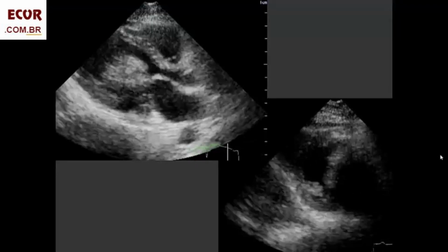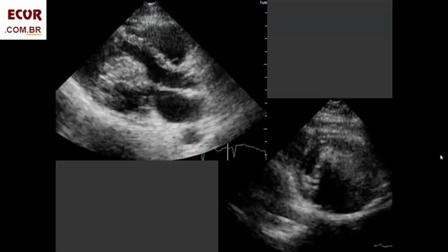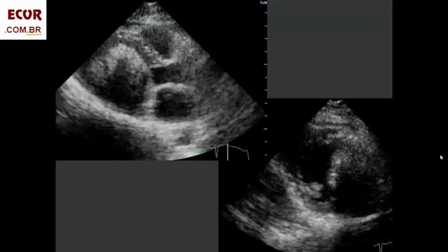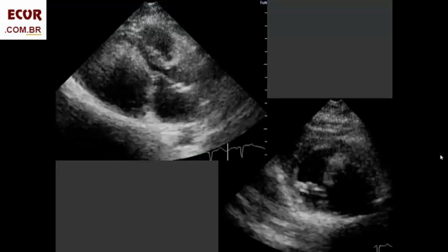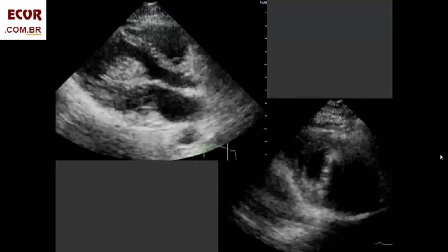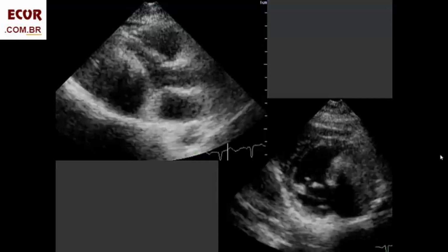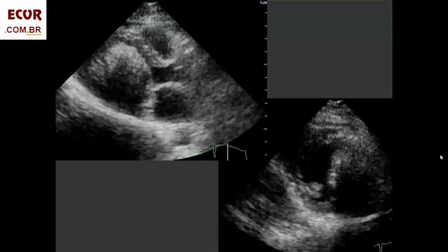Occasionally, we're surprised, as with this one here, a large mass in the left lateral wall. It seems not to be pediculated. By the aspect of this mass, as we are going to see next, it is very suggestive of fibroma, but surgery showed it to be a myxoma.